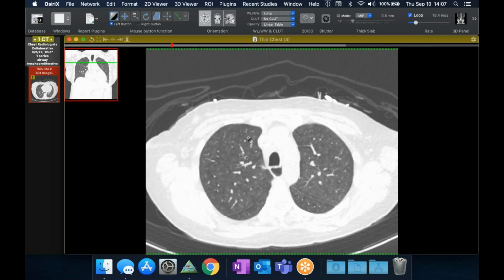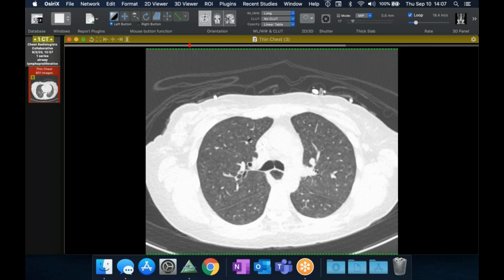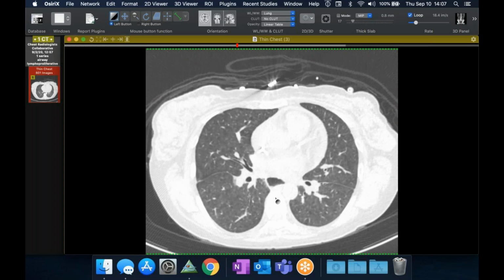Otherwise you'd wonder if this patient was a smoker, if this was HP, but in the setting of connective tissue disease, anytime you see centrilobular nodules, I always think about the small airways component. You wonder about chronic aspiration, but they're so diffuse and so clean looking everywhere that I think it's a concordant diagnosis. So follicular bronchiolitis, just as diffuse centrilobular nodules, which again, I've not seen that presentation.